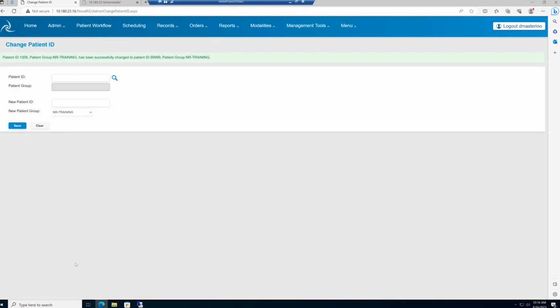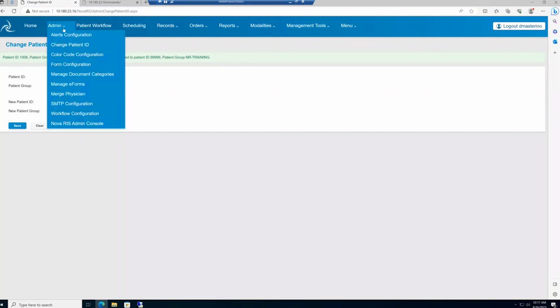I'm going to click on save, and you can see the successful message at the top that it was successfully changed. So it's a simple process as long as you know exactly what direction you're going in with the change.